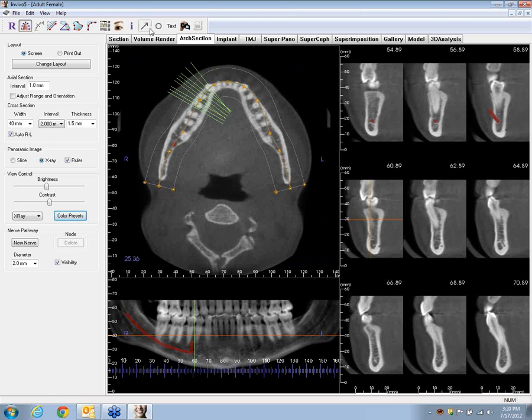Just like in the other tabs, we've got some ways of calling out or enunciating messages here. We can click and drag arrows to illustrate points. We can make a circle by clicking the center and pulling out the radius.